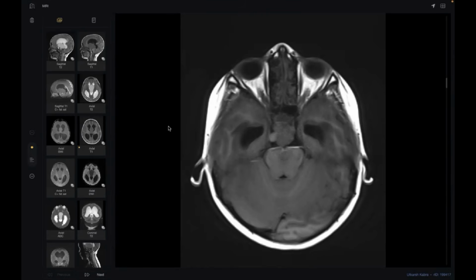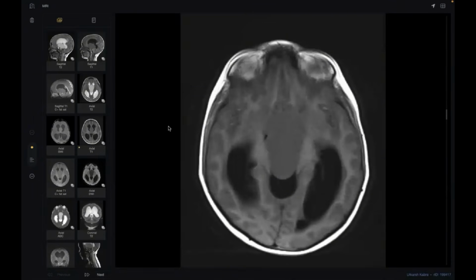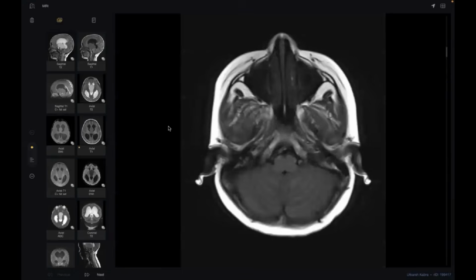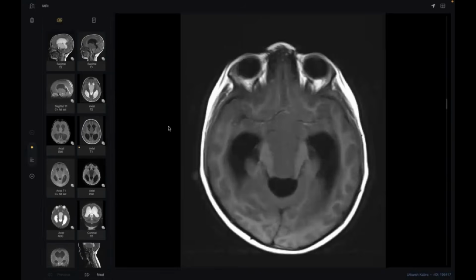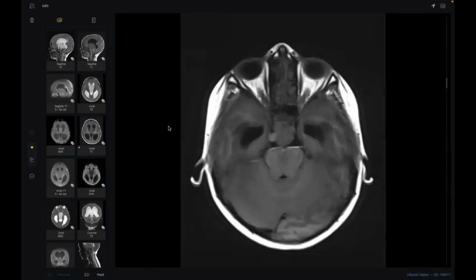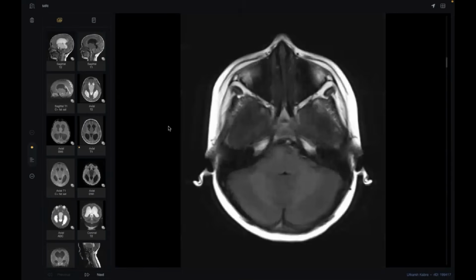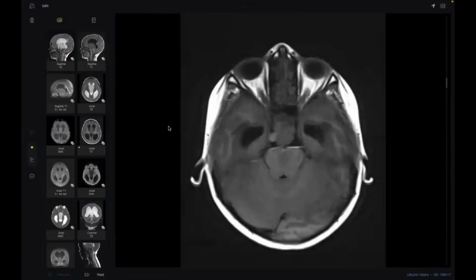May I request the remote control, sir? I will scroll for you to save our time. So the fourth ventricle appears normal, so I'm thinking that there is obstruction at the level of the suprasellar region.